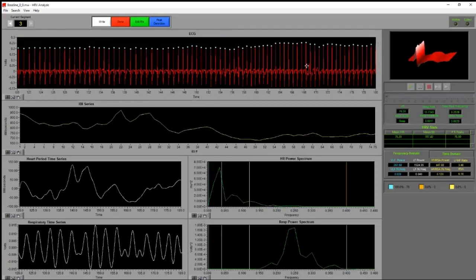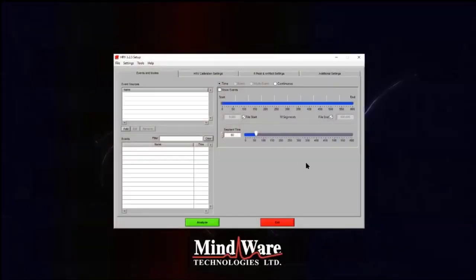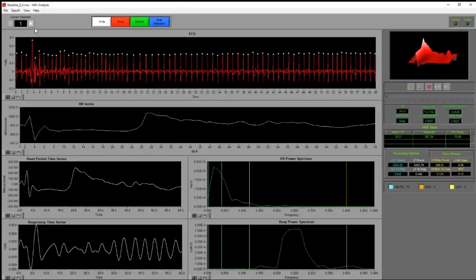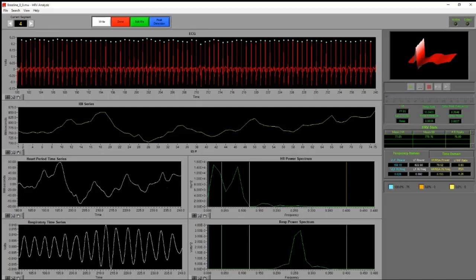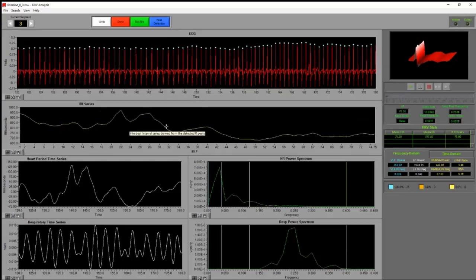Okay, so I think this will work. If we zoom in here, we can actually see what this person is talking about: if we have one of these right here, about 180 seconds, what do we want to do with that? In this specific case, I'm actually going to look at more data so that I can see what happens after that. If we couldn't do that, then this becomes a little more challenging, because what we're likely going to see is part of the ECG here, and then we're going to see the other part right here. And I want to ensure basically that it is a good beat and something doesn't occur afterwards. So if we weren't able to see after 180 seconds, I probably would just stay right here.